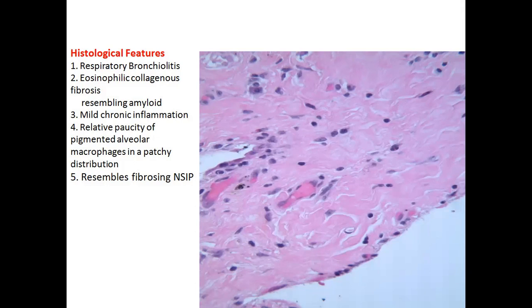Then greenish, which stains mucin and can highlight early collagen, when the collagen is in its early stages. And then black, which commonly stains elastin, whether it is present in the pulmonary arteries, bronchial arteries, or even the pleura. We will discuss the Movat stain in our upcoming videos as well.